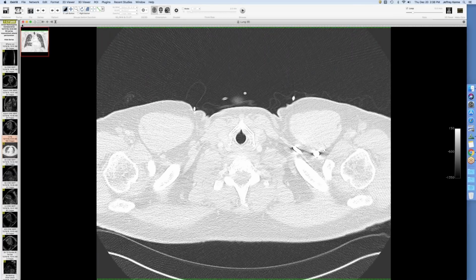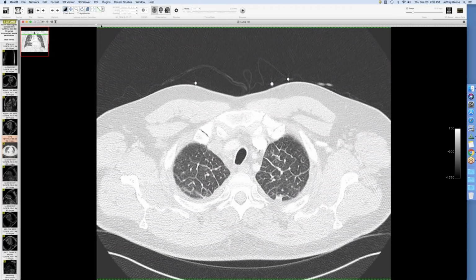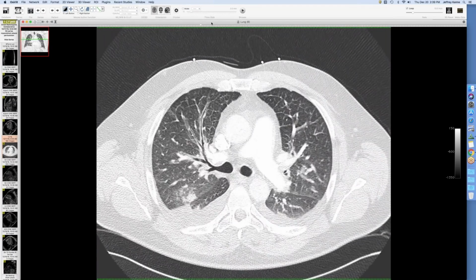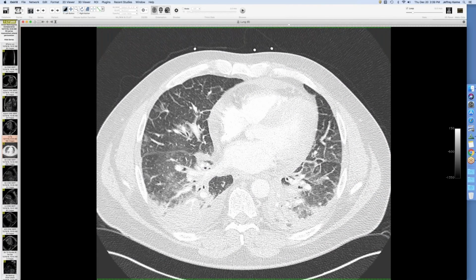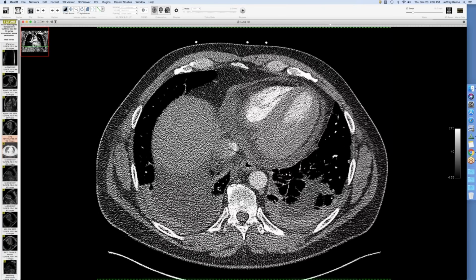His local physician would give him a lot of prednisone. He'd been becoming more short of breath and taking more prednisone. And you can see they did a chest CT at an outside hospital. It shows diffuse lung edema, pleural effusion. But he also has, I'm going to say soft tissues, but he's got a small pericardial effusion as well.